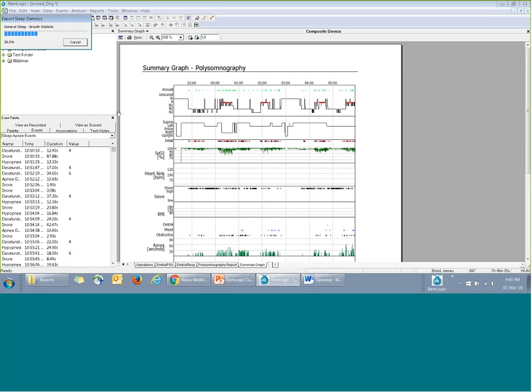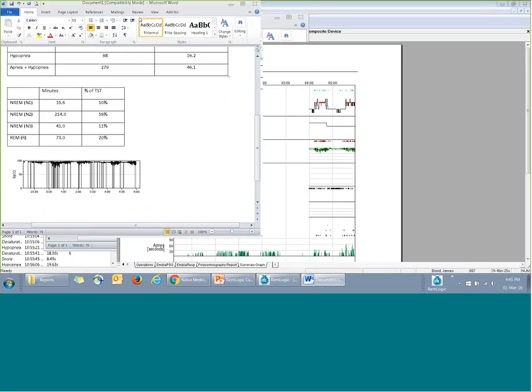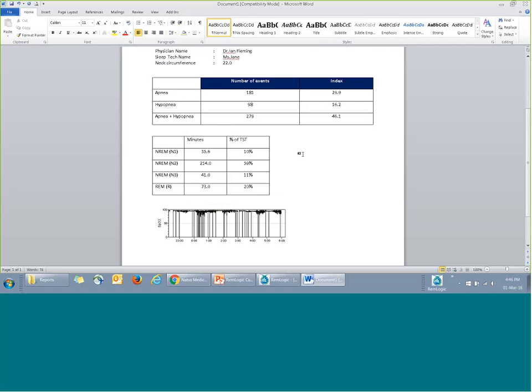So for RemLogic custom reports, if you can see the data in the default reports, if they have it, we can actually get the information and plug it into the custom reports. Okay. So when it comes to inserting graphs into your report, when you adjust the size, just try to be a bit more careful and adjust it slowly. Sometimes if you adjust too much, then the report will come out a bit distorted, like what you've seen earlier on.